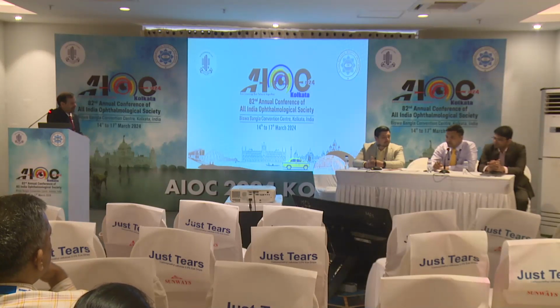Second question, sir, regarding the field of OCT angiography, you said that you prefer to do ultra wide field FFA. Now with Dream OCT being launched, it is giving us a 130-degree OCT angiography in a non-invasive way. Do you think it will do anything to change your practice? Because now you have a 130-degree field OCT angiography. I still think I will go ahead with FFA at this moment.